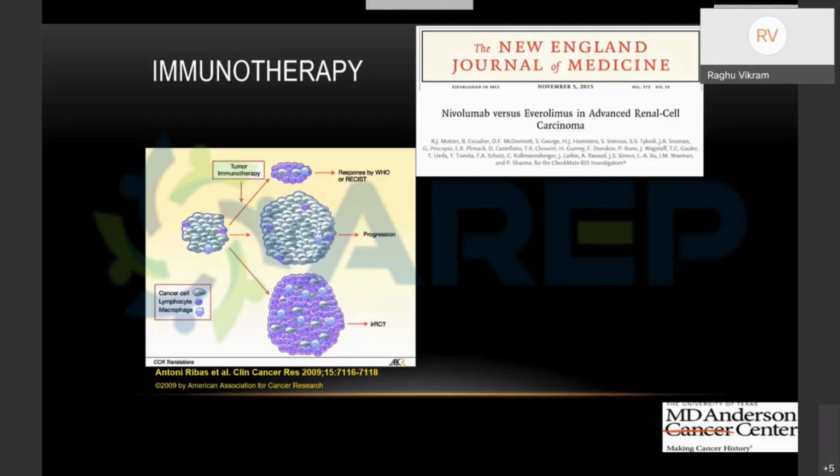And also the likelihood, if I see an enhancing renal mass, the likelihood of that being a renal cancer is already very high. So I don't need to really create another classification system for that. Whereas on the cystic lesions, it makes sense. You see cysts quite often. It's very common. And then now you're looking at septations and stuff like that. So that kind of helps.